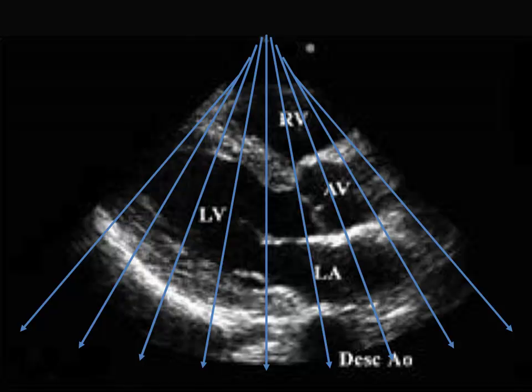So the line density determines the lateral resolution of the transducer. The more lines transmitted per frame, the higher the lateral resolution. But as you can see in this image of a cardiac probe, and unlike the case of linear vascular probes, cardiac probes, which are called phased array probes, tend to shoot the beam in a cone-shaped pattern. This allows for better imaging between the ribs where the imaging window is narrow, but also results in lower line density at deeper areas and therefore low lateral resolution.